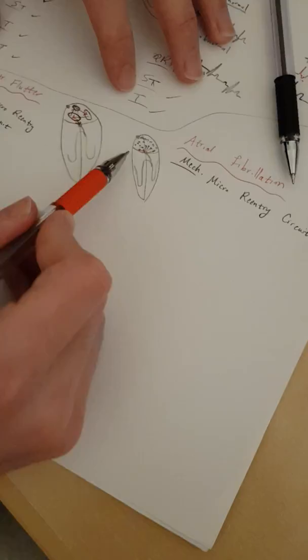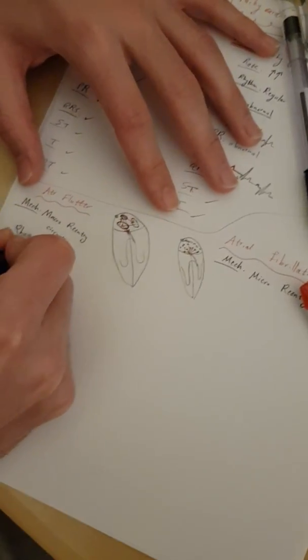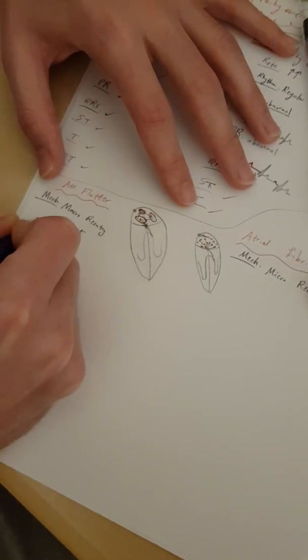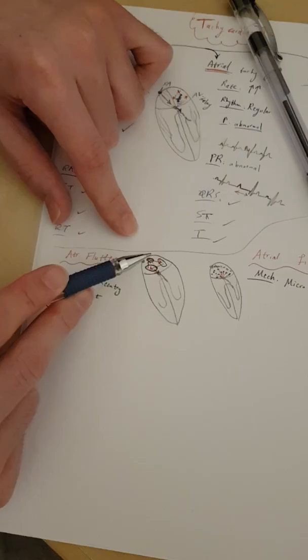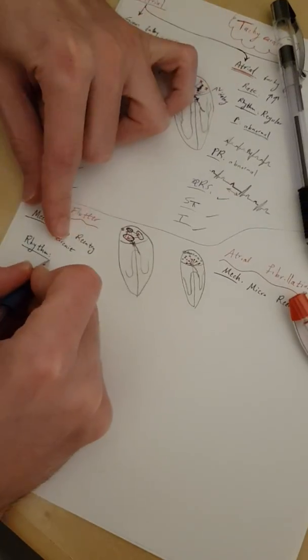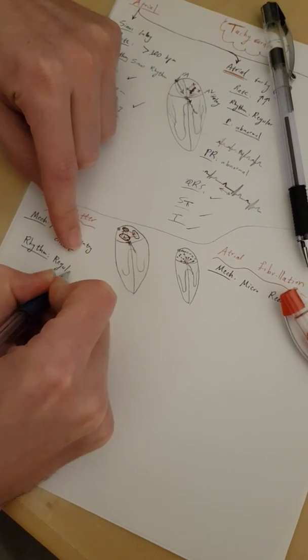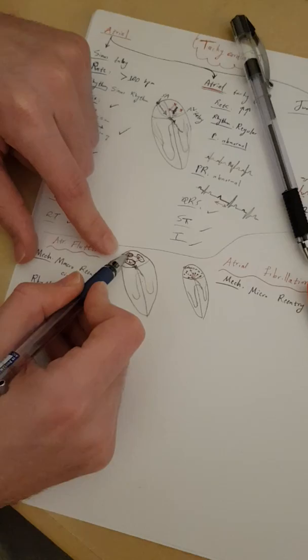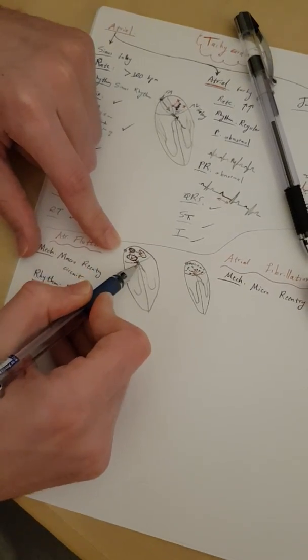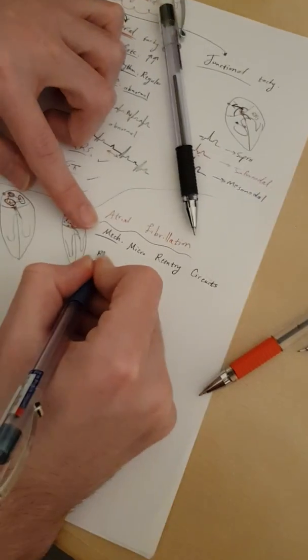So what do we get from these 2 points so far? It's very important, the rhythm. Here, the rhythm occurs at the same interval after the first one. That's why the QRSs that we get are always going to be regular. There's the same time between QRSs. As we said, QRS 1, 2, 3, QRS 1, 2, 3, QRS 1, 2, 3, like this. But this one is not.